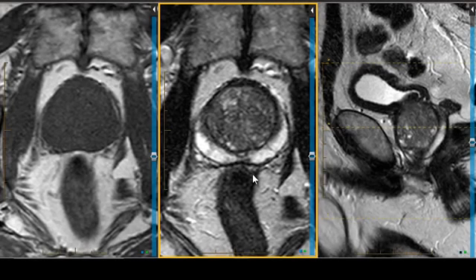So this vignette is about what do we name the baby? What is the zone nomenclature for a prostatic mass? We're going to start right out in the middle of the prostate gland, where we have a central gland, surgical capsule, peripheral zone or gland.